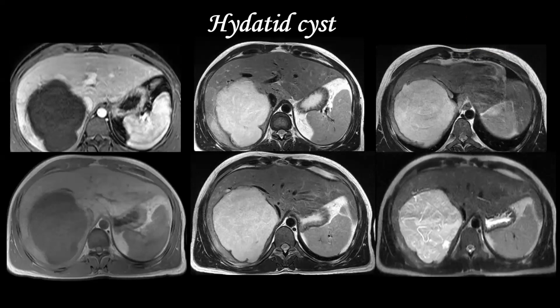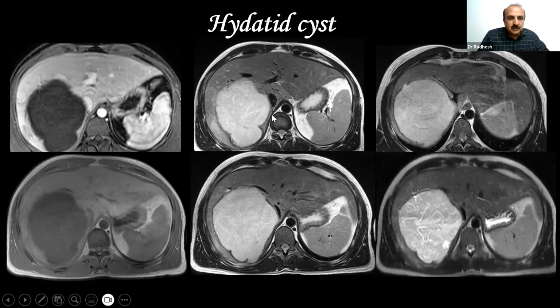Sir, in the STIR, I mean inversion, fat will be black alone. Fat is black. Sir, even in T2 it is black alone. In T2 it is not black. Now, if you look at T2, I'll show you. Let's look at it in this one.